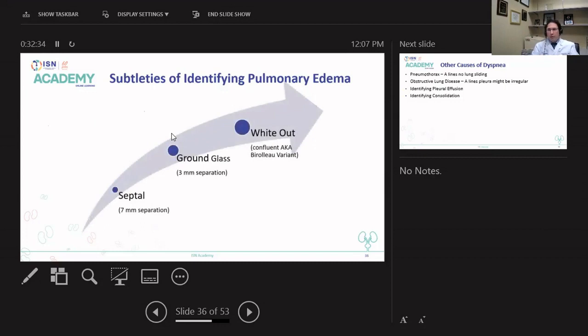And there's a continuum here. This is something that I developed an appreciation for later on, and this is what that pulmonary attending was talking about. What I had seen in the patient was septal B-lines of pulmonary edema. That's the water-thickened interlobular septa. It had not progressed to the point of alveolar edema, which would be more of a whiteout pattern. So that patient who was extremely short of breath acutely, it didn't correlate.